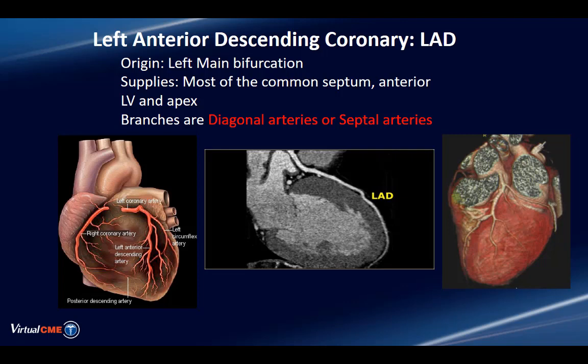The curved planar reformation technique has been used to go ahead and show the extent of the left anterior descending, and in this particular case, it is an apical wraparound vessel, a very large vessel, and probably much of the septal perfusion is provided by the anterior descending, and on a vessel this large, probably most of the anterior wall of the left ventricle has also been subtended by the left anterior descending artery.